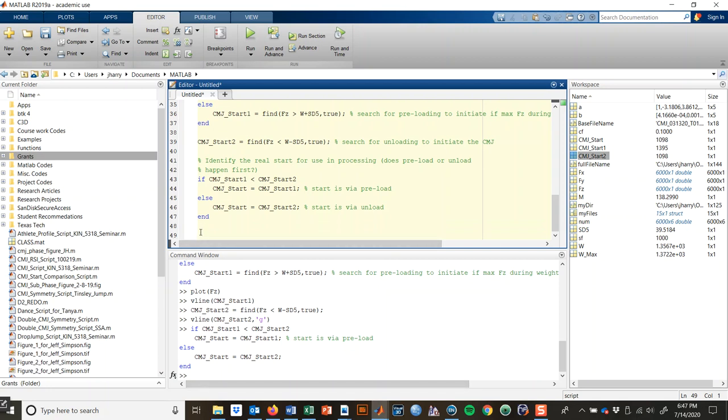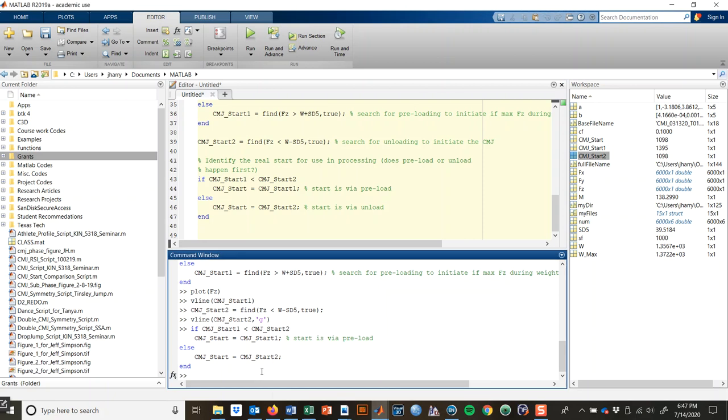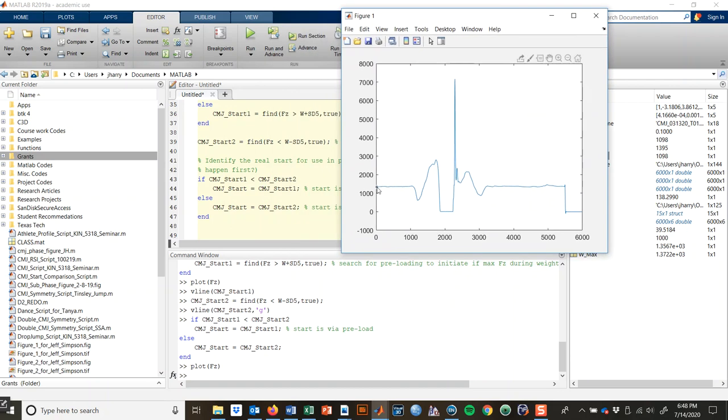Now another method that I'm just recently starting to adopt, I was a long, stubborn holdover of integrating. So if we're thinking of the force curve, I got rid of my graph. If I bring it back, right, I always start where the person is standing still. So I would usually have started integrations right here on that first data point, or well, calculate acceleration and then integrating.